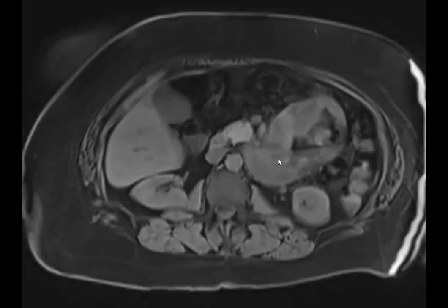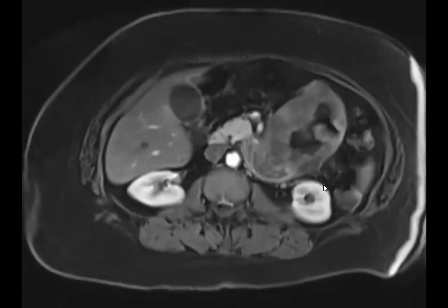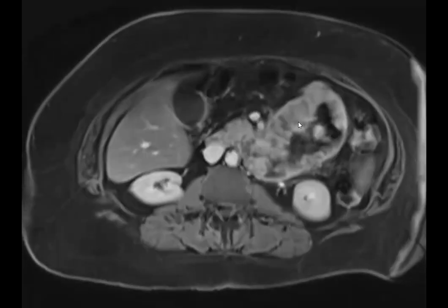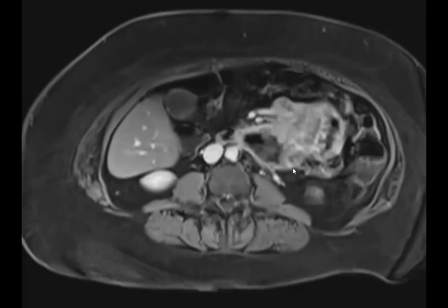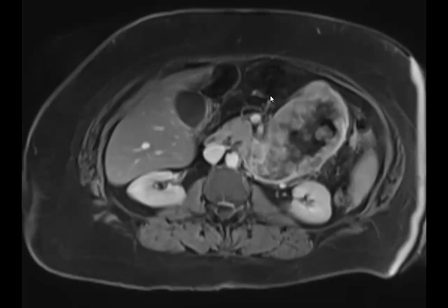On the pre-contrast, it's intermediate. Arterial phase, it's kind of lowly enhancing, and then on the delayed phase, it had more progressive enhancement. But none of that is really specific. That could have been for a GIST, it could have been for lymphoma. So anyway, just don't forget about adenocarcinoma. But great differential, good job.